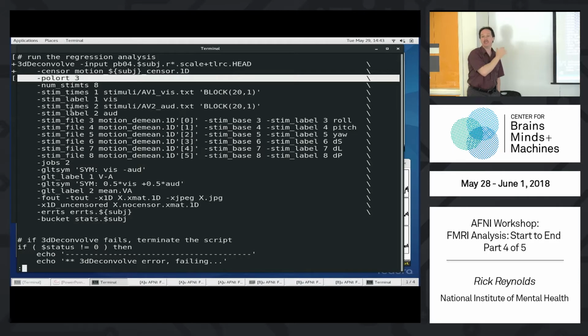And again, you can tell it otherwise. If you want to use drift modeling more like FSL or SPM, if you want to use sinusoidal modeling, you can do that too. It's not quite as convenient, but you can just use a polort 2 here, even if you use higher order sinusoids, because sinusoids can't match polort 1 or 2. So use polort 2 here, but then you can use the sinusoid functions as if you were band passing.